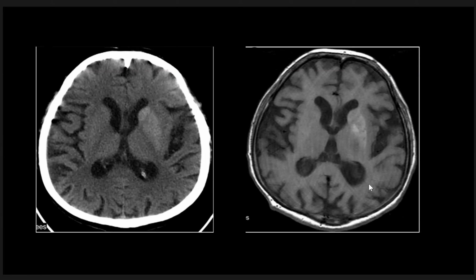And on the MRI signal in T1, we have hyperintense signal intensity in the left lentiform nucleus, as we see here, and a little bit hyperintense signal in the caudate nucleus as compared to the right one. Here another patient with hyper signal intensity in the putamen with hyperglycemia.